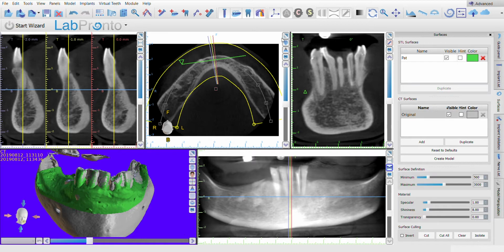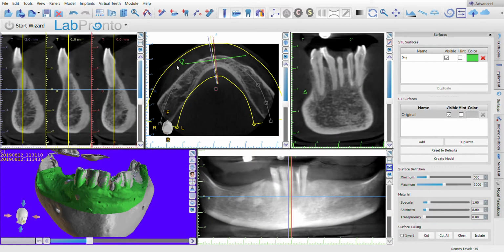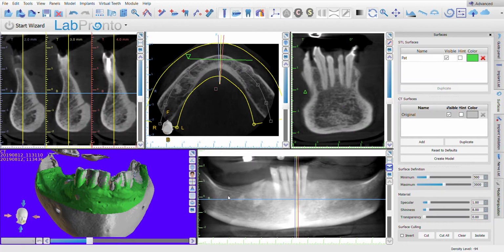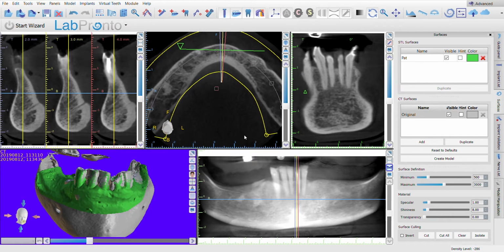This also, right now the computer has mapped my jawbone not exactly the way I wanted to have it. So in order for me to go ahead and map my jawbone, I make sure that you see this blue line. I try to put this blue line fairly in the midsection of the mandible. Okay, this blue line corresponds to your axial image. You see these numbers that are blue color? That's corresponding to this line.